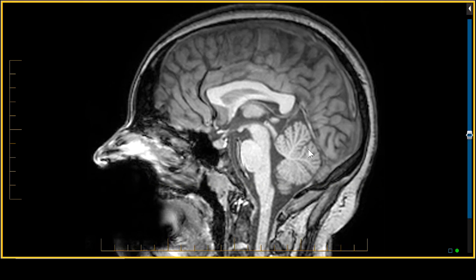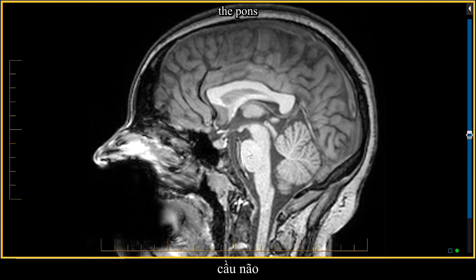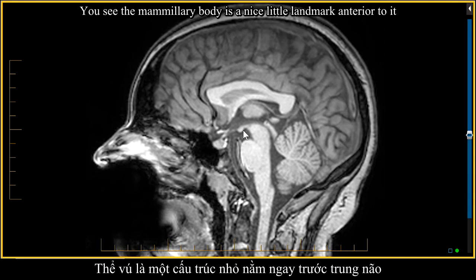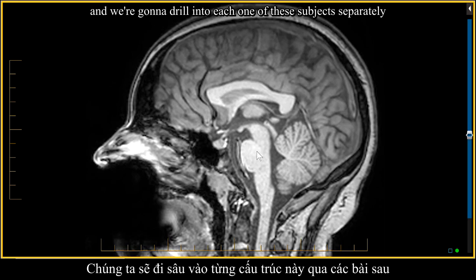in the midline showing you the brain stem, the medulla with the medullary clava, the medullopontine sulcus, the pons, the midbrain, and you see the mammillary body is a nice little landmark anterior to it. There's the pituitary gland and fossa. And we're going to drill into each one of these subjects separately.